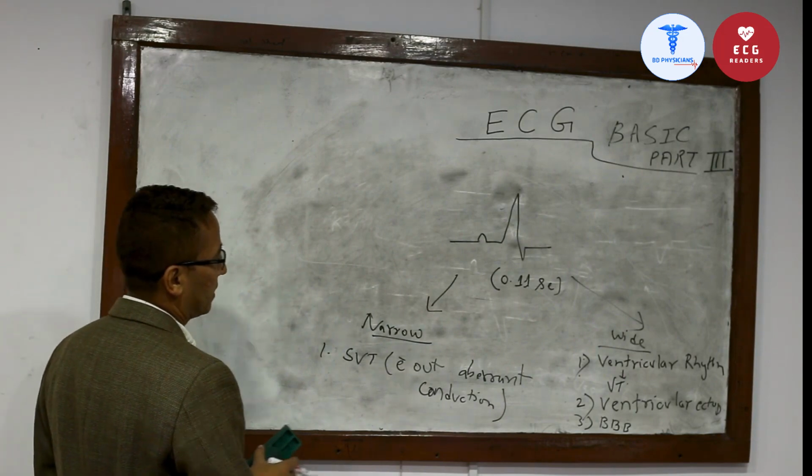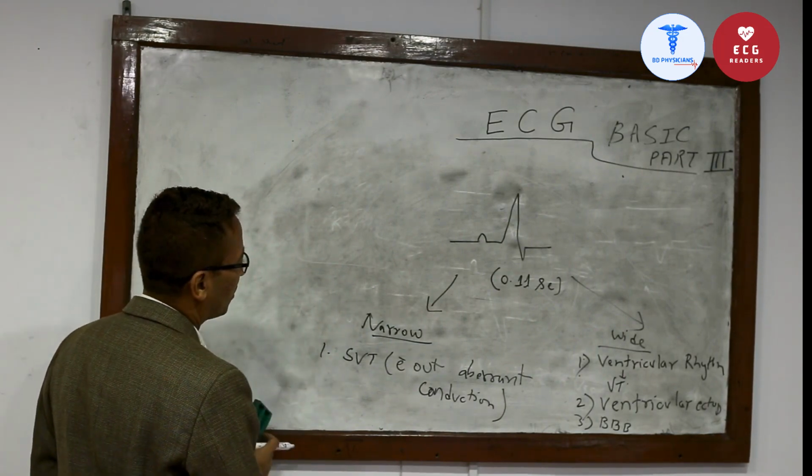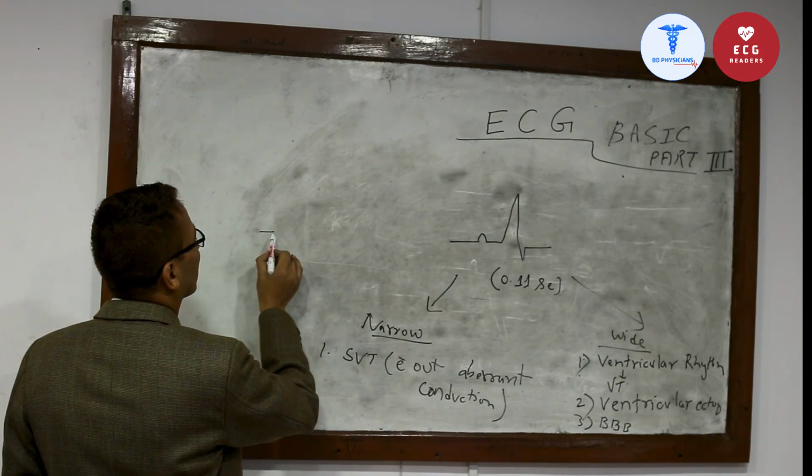Narrow QRS complex, as in SVT, looks like this.